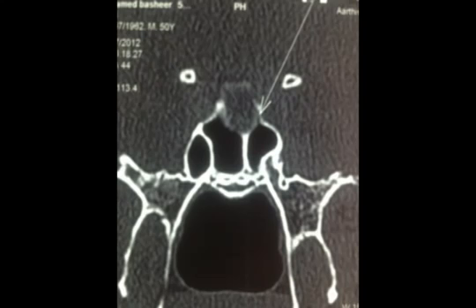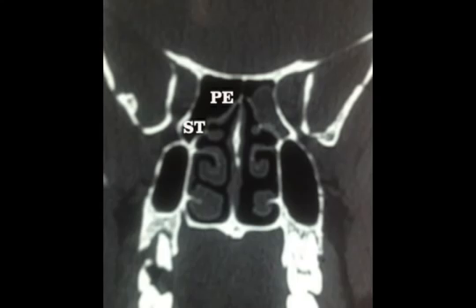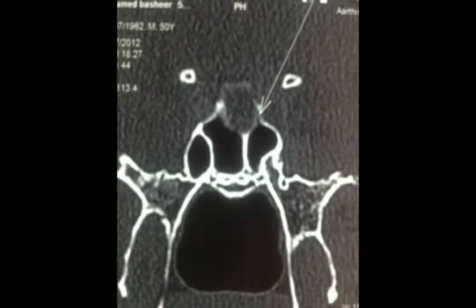This is for anatomy. Again, the class is emphasizing on reading the anatomy alone first. So that is why we put up the scan. Now you go to the pathology and say that you have a soft tissue mass in the posterior ethmoid on the left side, and then I will plan surgery on the left posterior ethmoid, and you can see the lesion very clearly there inside the sphenoid, and this is a soft tissue mass in the sphenoid sinus on the left side. This is actually a meningocele.